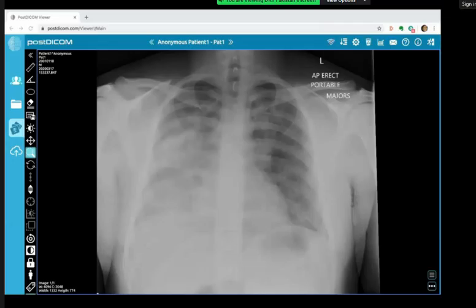So this is a 19-year-old, previously normal chest X-ray. This is a frontal chest X-ray in an adult patient. It demonstrates significant abnormality on the right hemithorax with airspace opacification in a perihilar distribution, also extending down to the peripheries, involving predominantly the whole of the hemithorax, sparing the right apex, with a more confluent area in the right mid-zone. On the left, again, there is some perihilar opacification involving the left upper and mid-zones.